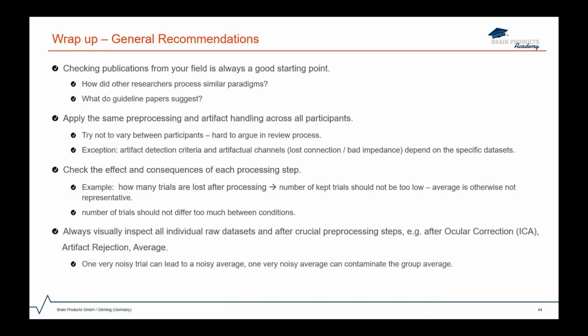Then always visually inspect all individual raw data sets, and after crucial pre-processing steps, especially the ocular correction ICA, which if we, for example, remove too many components, may create some distortions in the data. So we can visually confirm that this is not the case. And only compare waveforms with the same reference.